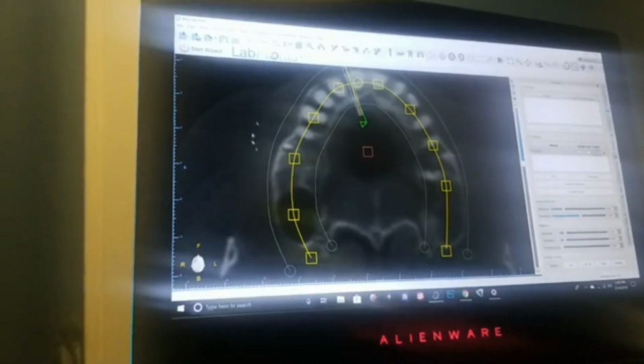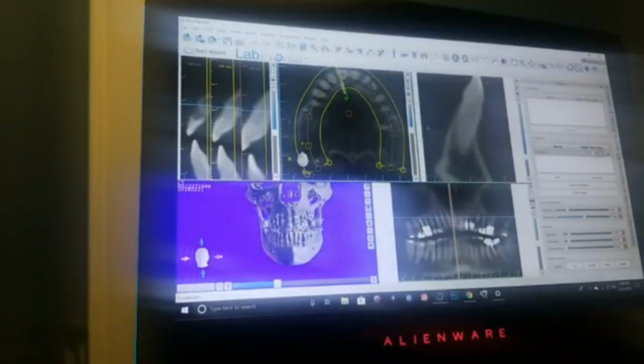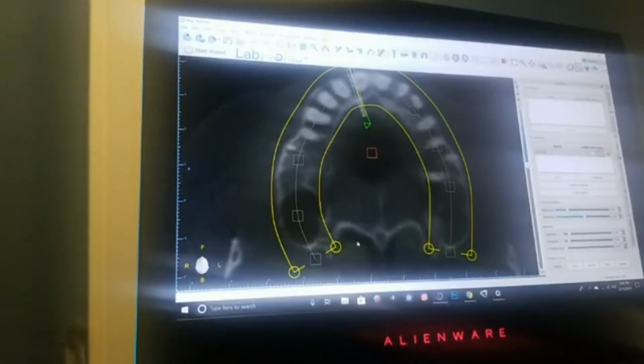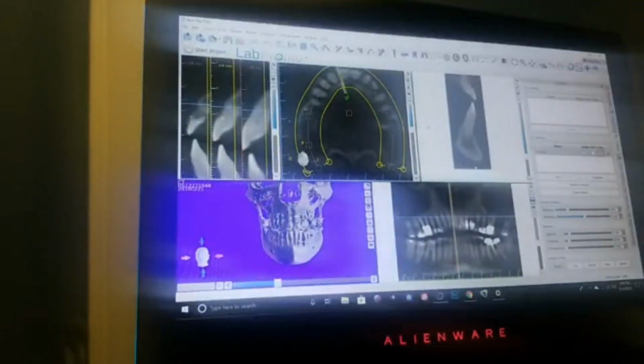Now we are working obviously on a CT scan, so this yellow line is highlighted. But if I minimize it and go into the panoramic view, now I've got the yellow lines outside, as we discussed before, right? So everybody remembers that. Now here we go. Take a look over here at my tangential.